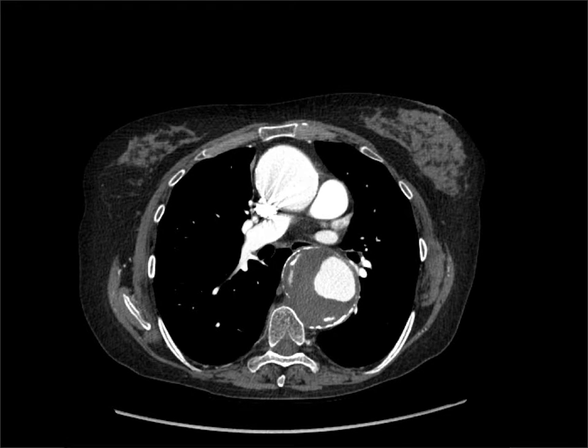And just out of interest, we can see here on her axial CT, here's her ascending aortic aneurysm, here's her descending aortic aneurysm, and you can see that it's completely filled up that retrosternal window.